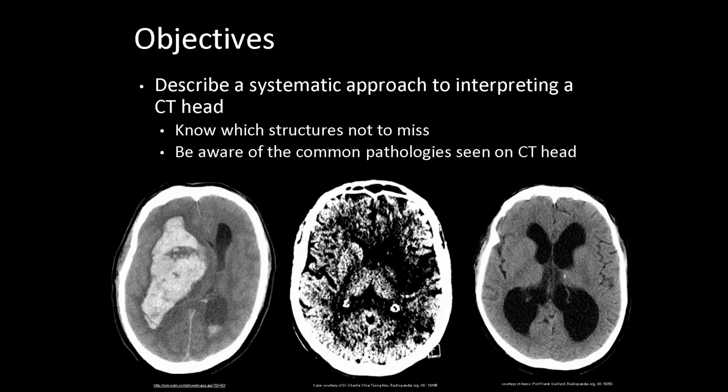So what are the objectives of today's video? Well, I'll describe what my systematic approach to interpreting a CT head is, and that'll include which structures and pathologies not to miss, and the most common pathologies that you'll see on a CT head.